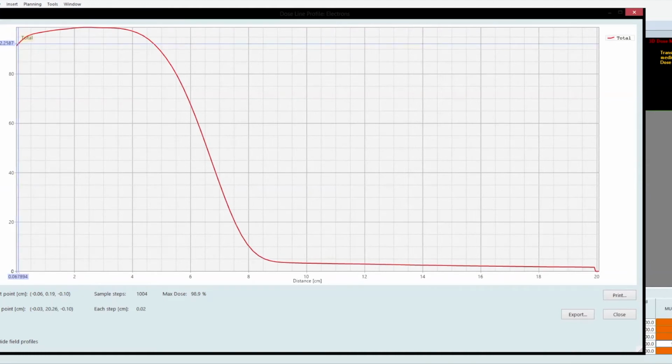This is where high energy electron fields start to lose their luster, because if I need to use a high energy electron field to penetrate 5 centimeters deep, it's probably not likely that I'm going to have tumor at the skin surface that needs to be treated. So why would I use a high energy electron field to treat something so deep that I still need to have skin sparing, but I'm not going to? And we'll see that for 20E as well. We fry the skin by giving it greater than prescription dose by prescribing at these lower isodose lines.